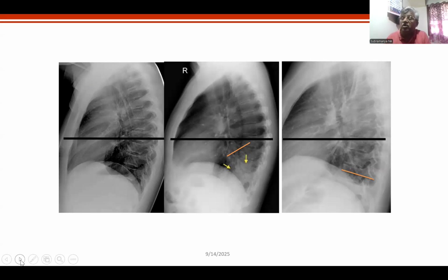Left main bronchus will produce a black hole end on. I'll just show you in a lateral film. Can you see here? Left main bronchus. I'm not getting a perfect film here. Can you see here? This is the trachea and left main bronchus. Left main bronchus produces an end-on hollow view.